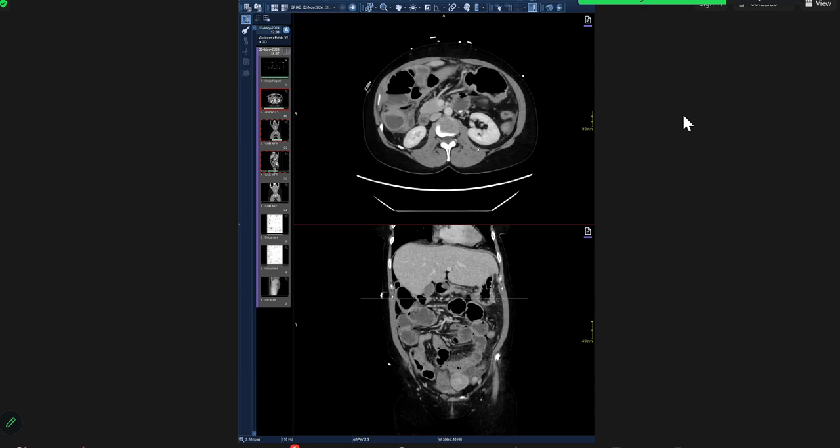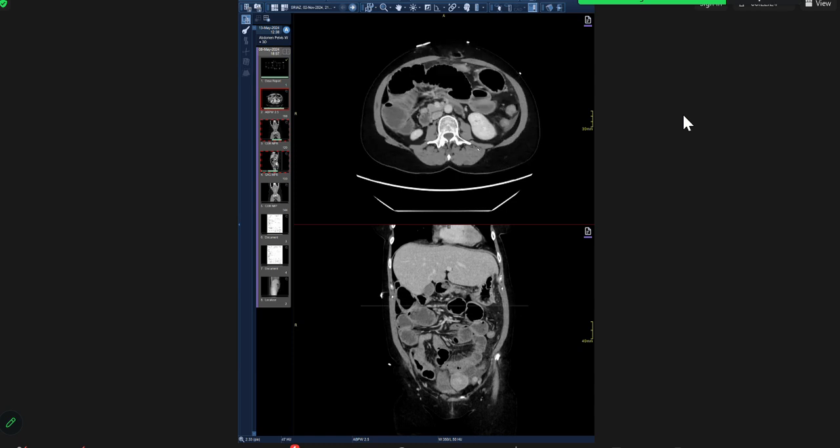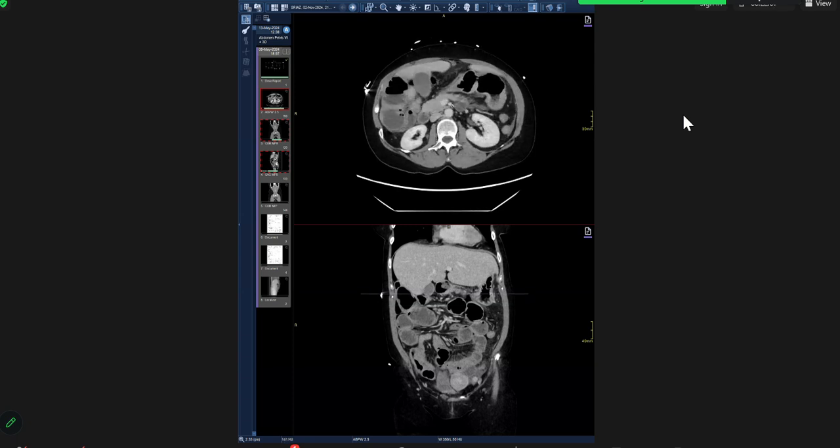First of all, establish, do you see a transition point? Always try to look for that transition point. Once you have established it, look on the lung window for air. Even if there is less time, they're going to say there's no free air because they don't want to show you the lung window. Third thing is look at the mesenteric vessels. Is there a mesenteric vessel thrombosis?